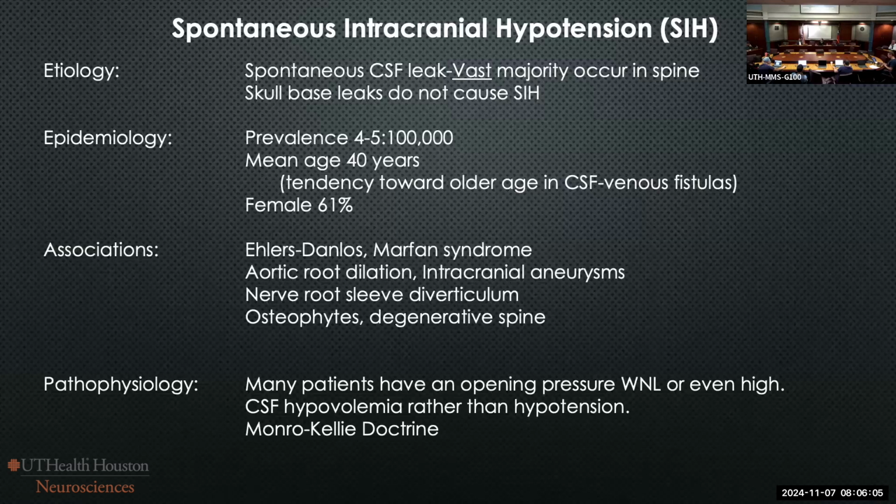A lot of the things I'm going to show you, not all, are explained by venous hyperemia, engorgement of the veins, because they're most compliant. They're the thing that can respond the quickest to a loss of volume. So you're absolutely right. Good.